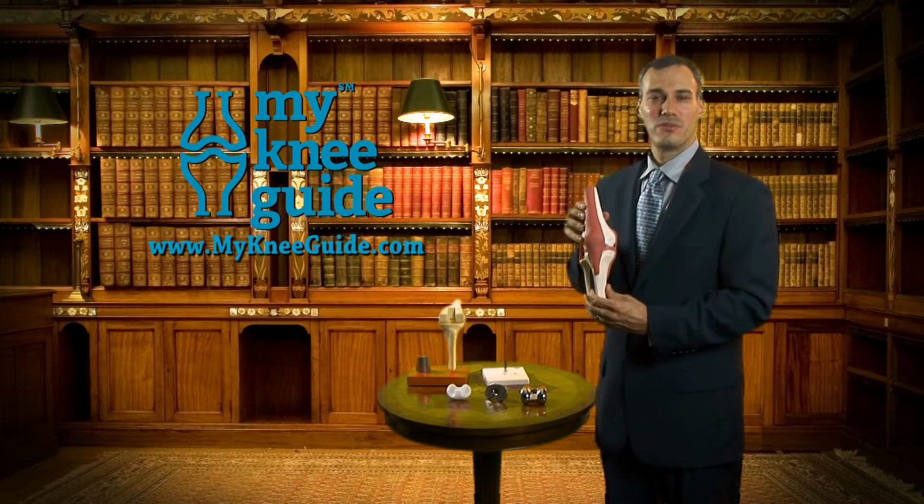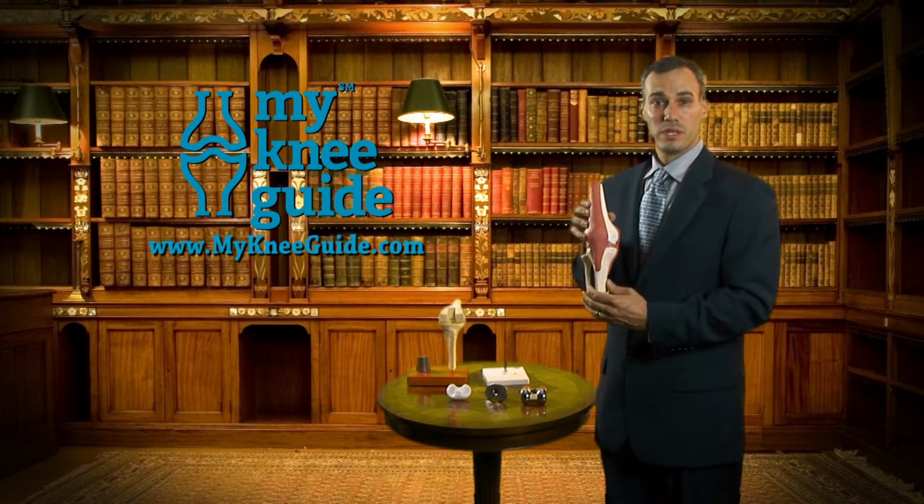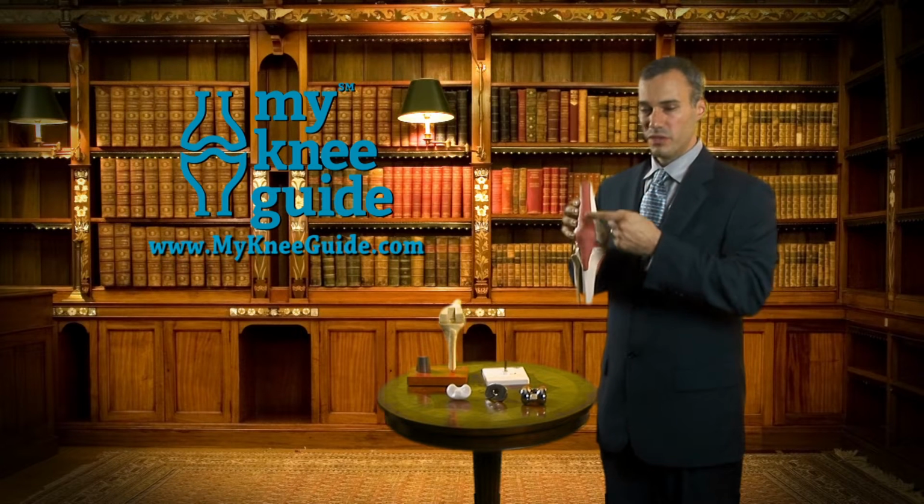This video will take you through the steps of knee replacement surgery. I will do this with the use of anatomic models. First, once you're brought back to the operative theater, your knee will be prepped and draped. The surgeon will then make an incision along the midline of the knee.